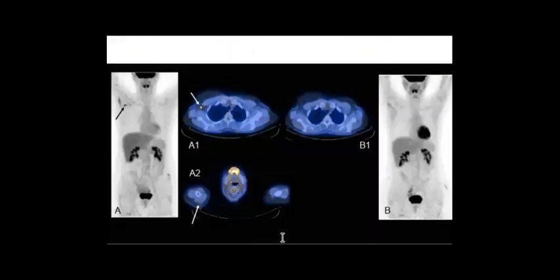So you see the thickening here and the soft tissue as well with the high uptake. So I think it's easy now to think that it is coming from a left piriform fossa tumor, right? Okay, it's easy. I hope that can be easy with you.